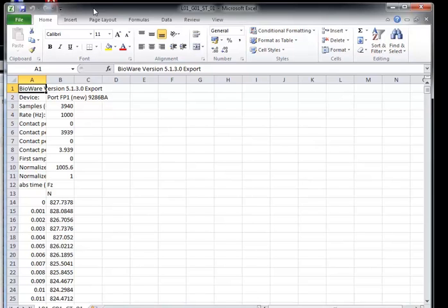When we downloaded the data, we only have 2 columns worth of data. On the left, you have the time. And on the right column, column B, we have the force data, which if you look in row 12, FZ, so force in the Z direction, the vertical, and it's of course measured in newtons.